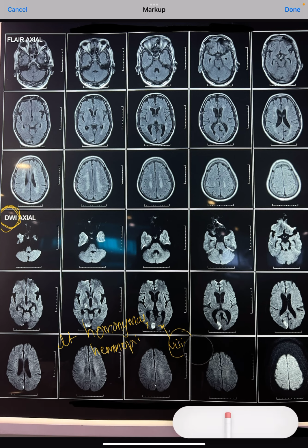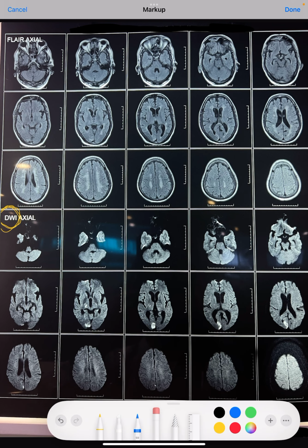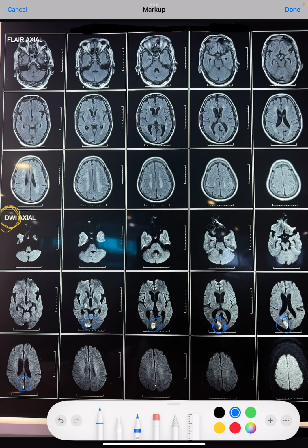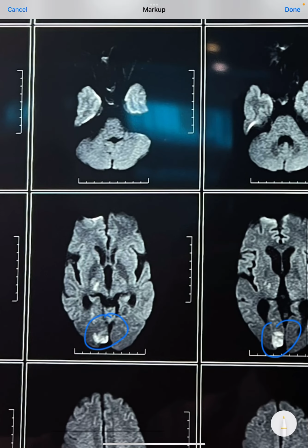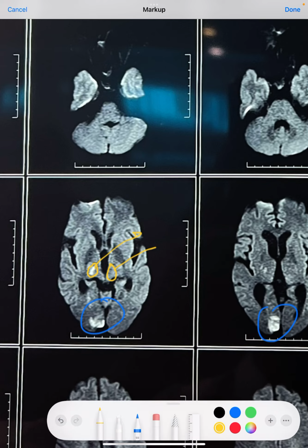So in this particular MRI, we are very crystal clearly able to see the involvement of this occipital cortex. This is all occipital cortex, which is linked with vision. And very commonly, you can see there is hyper intensity of this structure also here. So compare this on this side. Here it is normal and here it is hyper intense. There is diffusion restriction. This is typical thalamus.